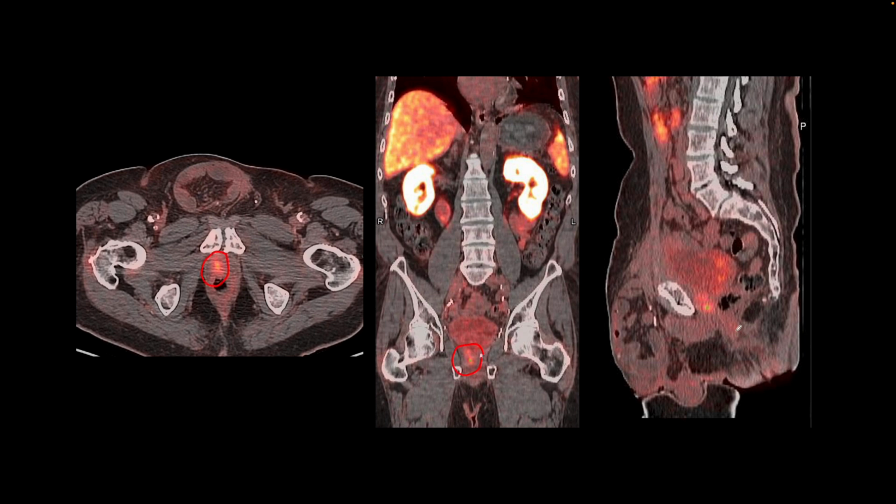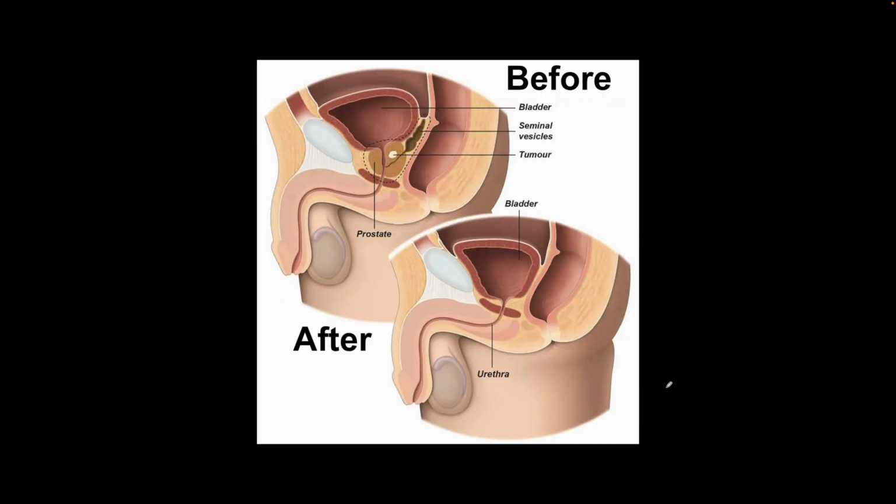In this situation, when the patients have had prostatectomy and the PSA is rising, PSMA PET-CT picks up local recurrence or metastatic disease at very low levels of PSA. And here we see local recurrence.